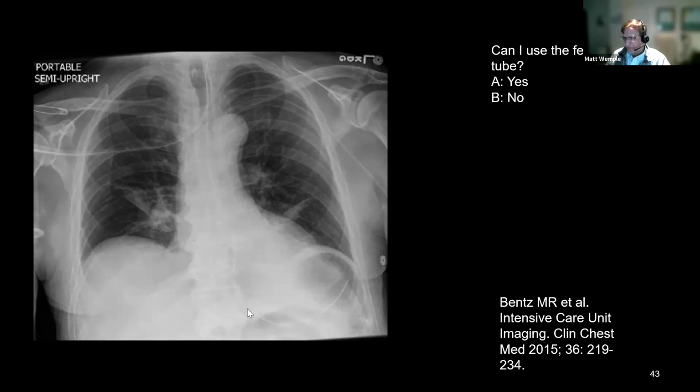So I think this one is going straight down, and then once it gets below the diaphragm, it deviates, and it's going kind of up, but it's not going up in a direction you want it. It's not going up in a concerning direction, I would say. And you could definitely know it's below the diaphragm. You see it pretty clearly here. So this is a good tube to use.